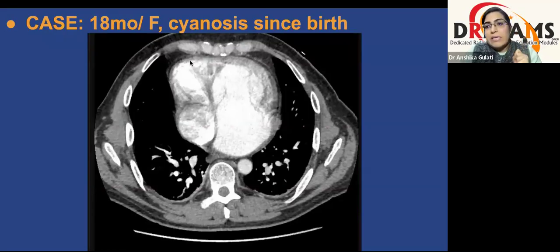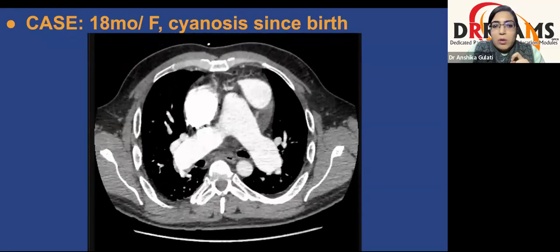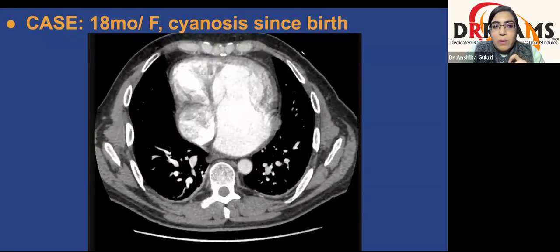And if you remember, we discussed last time that this arrangement is associated with a large number of congenital heart diseases. So step 1 is done, situs solitus. Step 2 is ventricular topology. This is one ventricle with smooth septal surface. So this is morphological left ventricle. And this is the other ventricle with this moderator band. So this is morphological right ventricle.